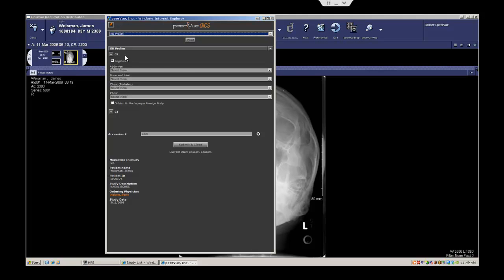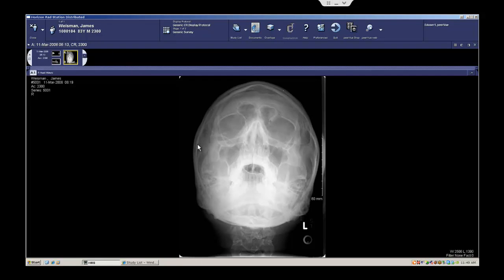Within the ED prelim panel, this is typically custom defined for the individual department needs, defaulting to a negative exam, and then displaying and breaking down specific diagnoses for positive findings by anatomy or other type of body part in correlation to the modalities being read by the emergency department. In this case, we're going to define this result as being negative. So the ED clinician can simply, with one click, launch the study from their exam work list in PACS, and with one click, submit a negative ED prelim finding.